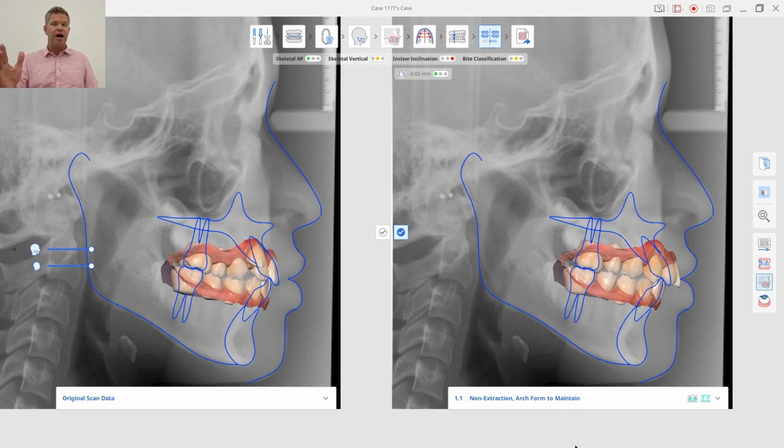And this is such a valuable tool for the patients to see because right away they can see that if I want to straighten my teeth, I've got to place some mechanics in here because I do not want these teeth to go so far forward. So again, this is another safe viewpoint to have on the screen while the doctor comes in the room, where the patient can start to understand some orthodontics, start to see what they want to see, and really lead to a good conversation with the doctor.